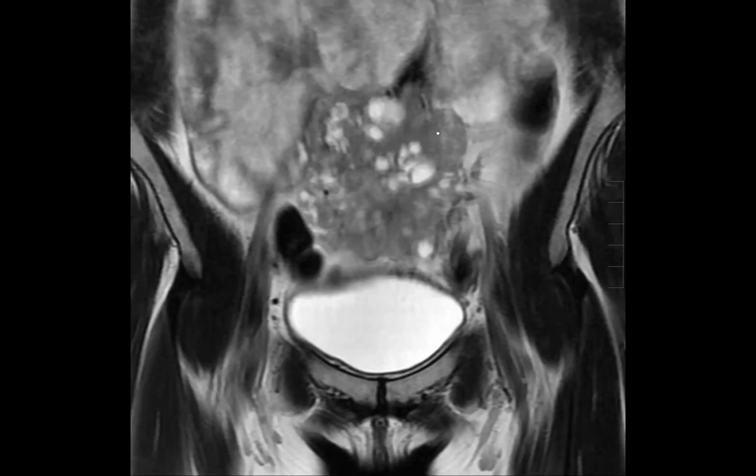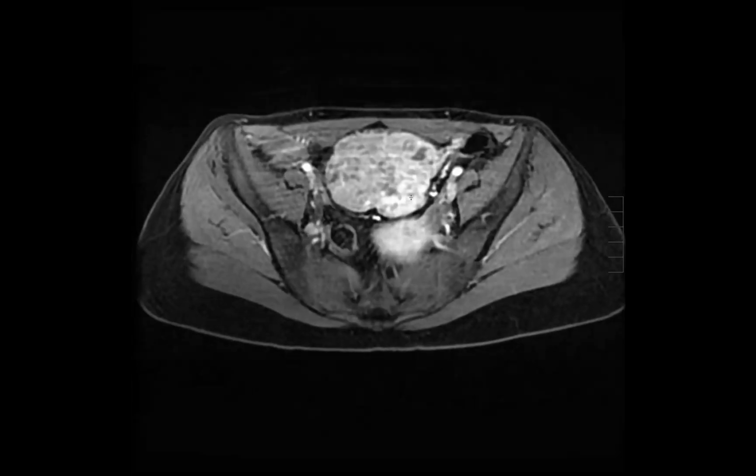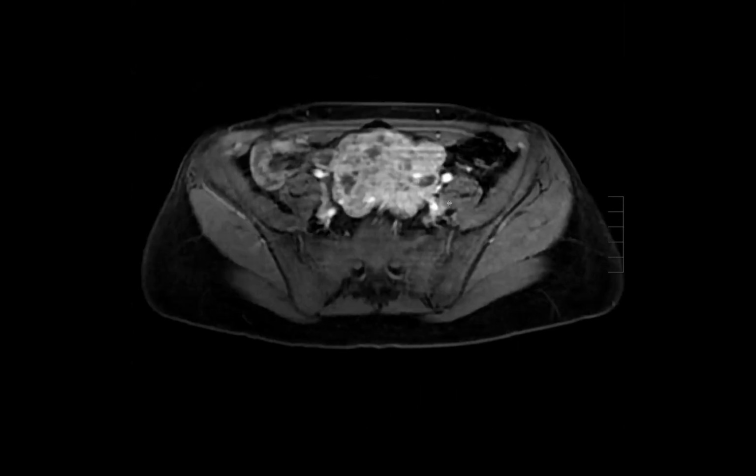So is this what you're talking about? Yeah, I guess I was thinking of that dark thing, but maybe that's just a big vascular stalk. I think so, because there's a flow void there. And do we have contrast? We do. We don't have coronal, but the outside did acquire axial. So yeah, that's probably the vascular supply to that mass right there.